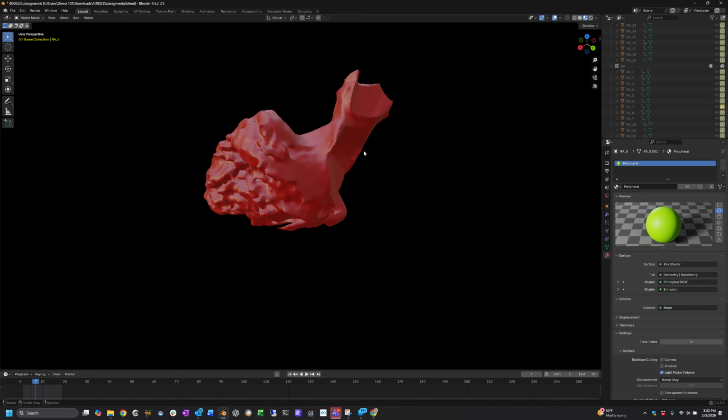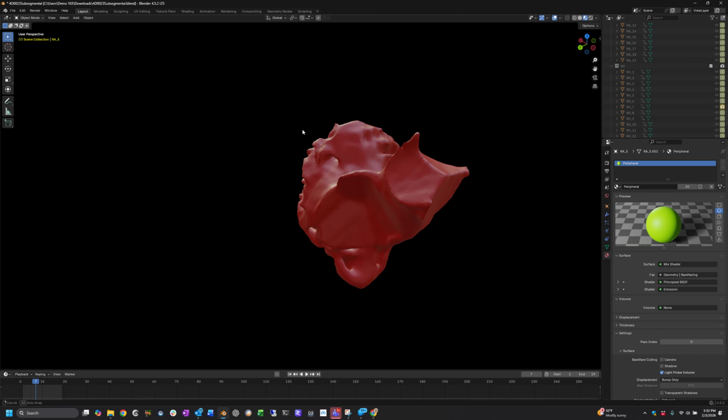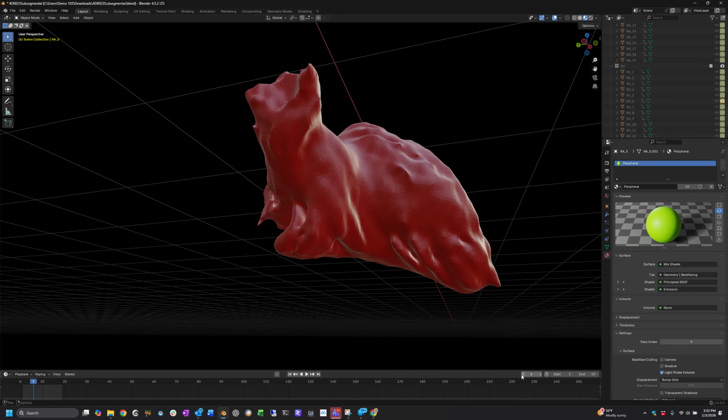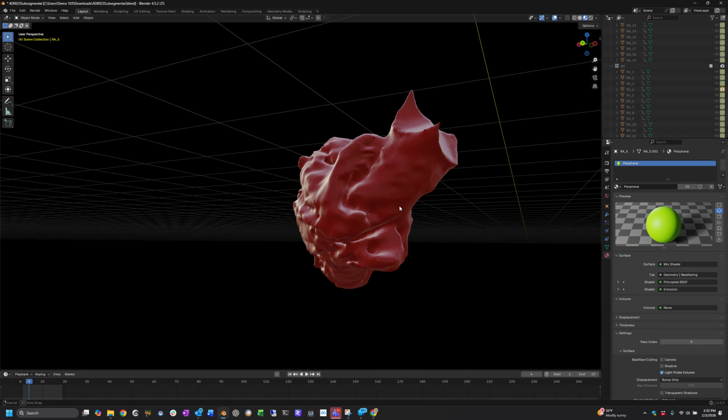We are going to have to eyeball it in the training, in the manual segmentation, but I think there's a chance that a 30-degree cut along those lines will get us where we need to be. And see here in 4, let me go back to 4. This looks like maybe 15.